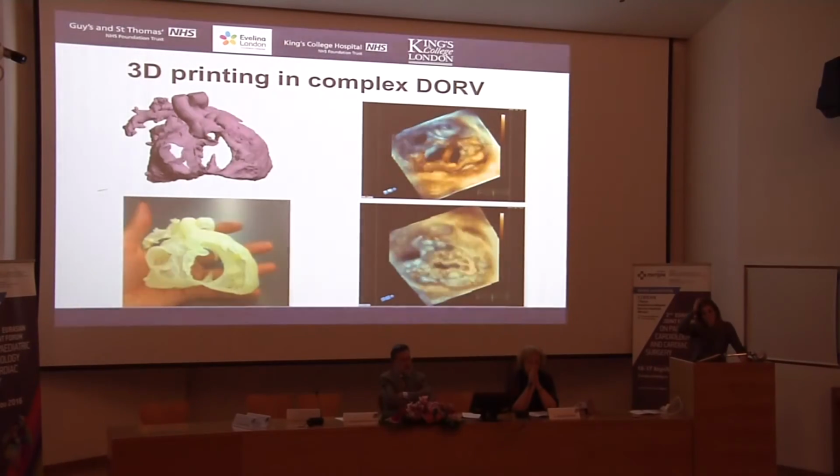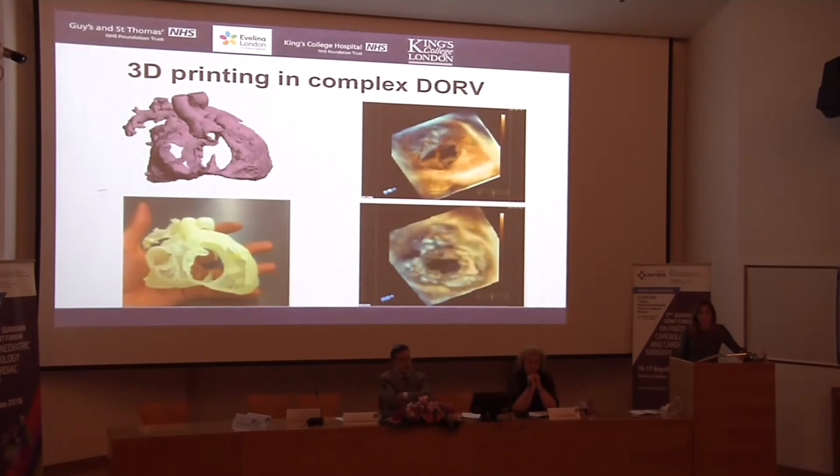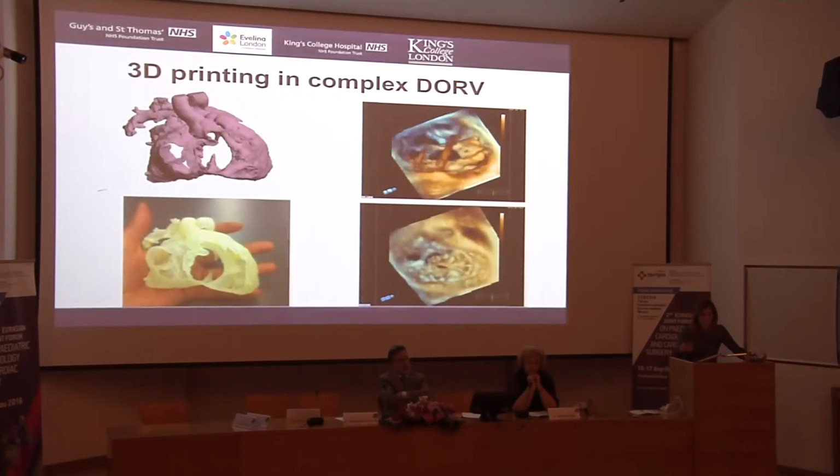Now, one of the issues with 3D echocardiography, of course, has been the technology that we use in order to display 3D images. It's all very nice, we have the 3D images, but we keep displaying them on conventional flat screens, which is actually a 2D projection. And we're trying to use different tricks, like color coding, to give us the perception of depth.